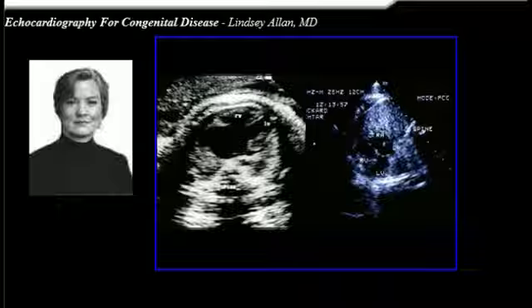The important thing is it's associated with complex disease. There was anomalous pulmonary venous return, there was asplenia, there was a common atrioventricular canal, double outlet right ventricle, and pulmonary stenosis. So a series of disease that is very complex in terms of the future. It's going to be a one ventricle repair, it's going to be a very complex disease, and this is another example of the kind of disease where the complexity of it might make the parents choose to interrupt the pregnancy.